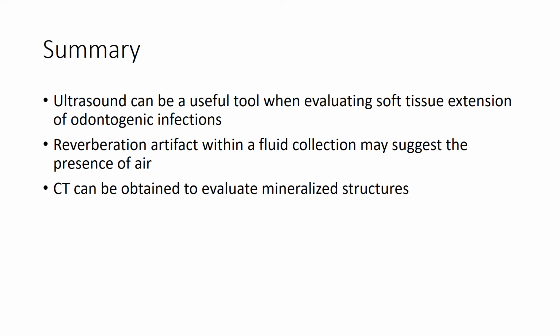To summarize, ultrasound can be a useful tool when evaluating the soft tissue extension of odontogenic infections. Reverberation artifact within a fluid collection may suggest the presence of air, and CT, if indicated, can be obtained to further evaluate the mineralized structures such as the bone and teeth.